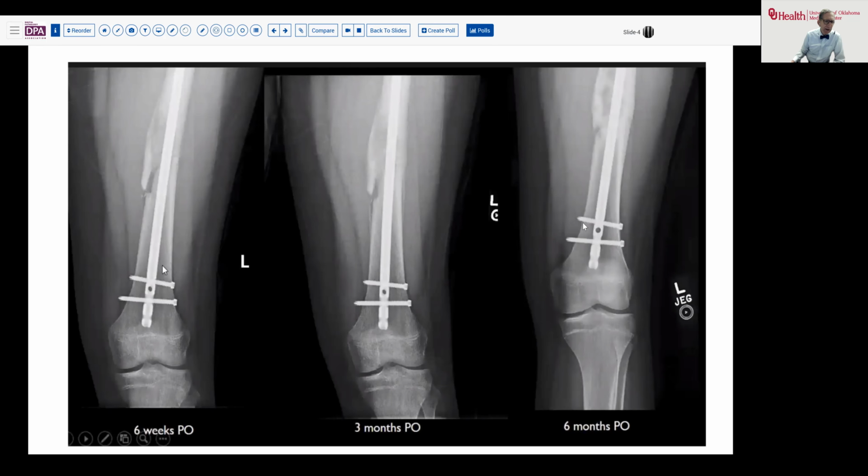But then at 6 months, this callus begins to look a little bit funky. It's still a little bit more like a callus, but we have some lucency and we have some expansion of the cortex here, as you might expect with some healing. And we began to heal in this defect here to a certain degree. So probably still on a course to be expected.